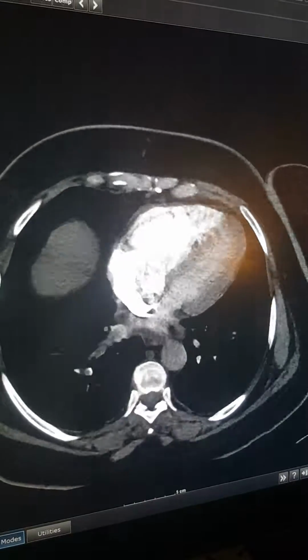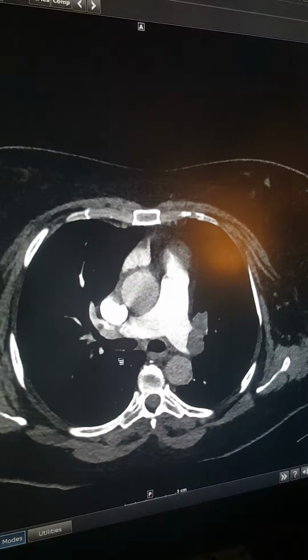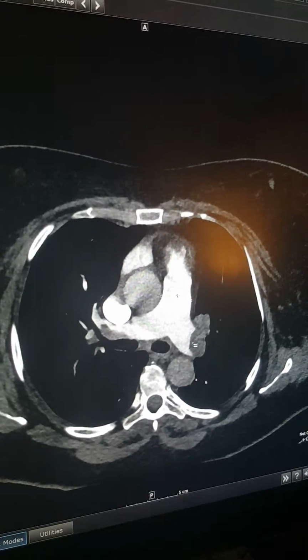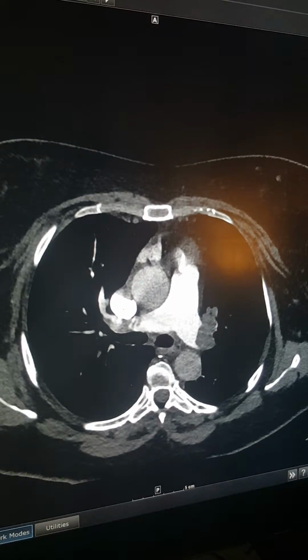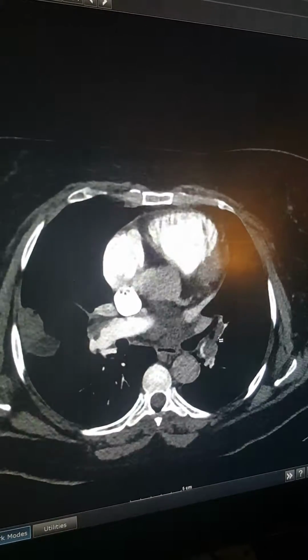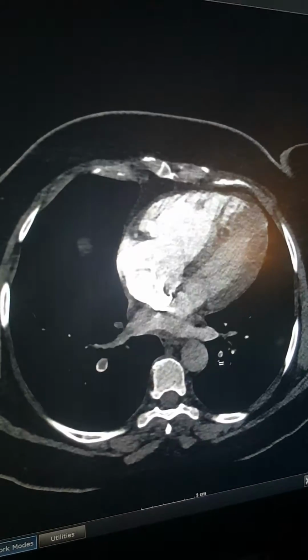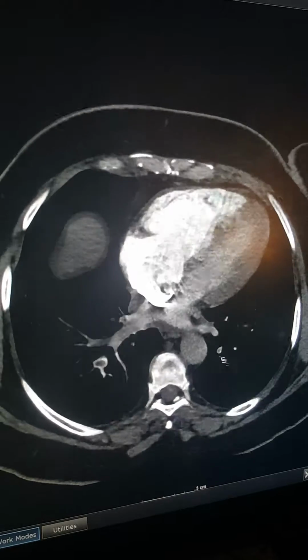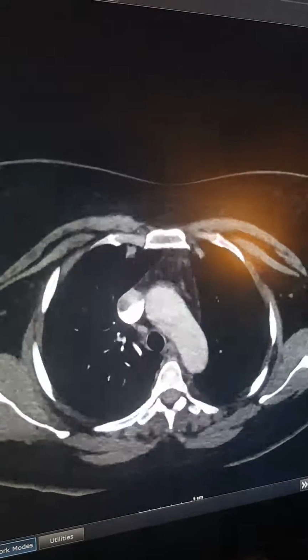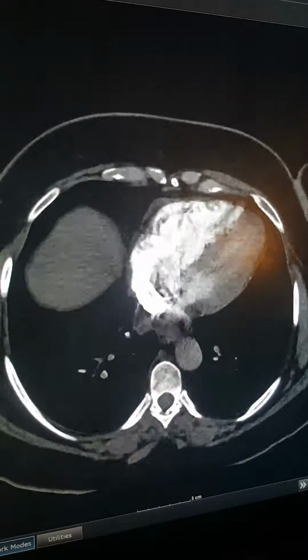Very interesting. Yeah, and this is actually involving both lungs. So here we can see it on the right side, and here is the left side. So this is the left main, and the lobar branch going down to the segmental, and here are the subsegmental branches. And again, the problem with acute pulmonary embolism is the effect on the heart and the cardiac strain.